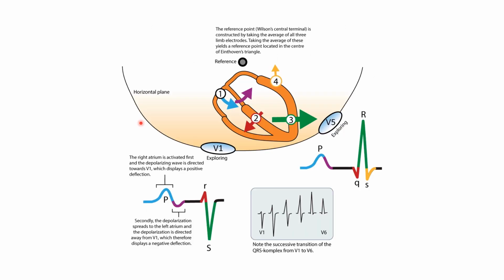All right, then what we're actually measuring in the ECG is, we talked about briefly, that the depolarization of the atria is the P wave. Then comes the depolarization of the ventricles, that's the QRS, and then the T wave is the repolarization phase.